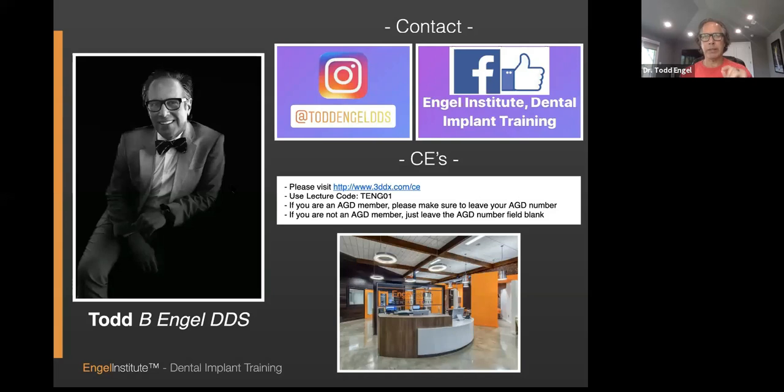This one, if you can identify that the implant is indeed located in the bony housing and you have that at the bottom and you don't have it at the top, you can pretty much rule out compression necrosis, which happens typically around the platform. If you have a nice clean circle at the bottom and the top is good, that typically means heat from the drill.